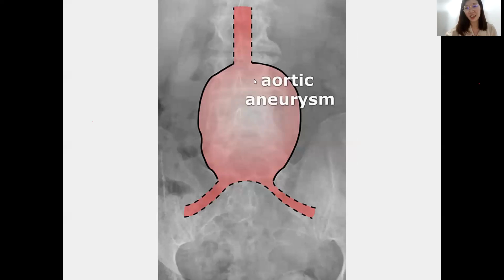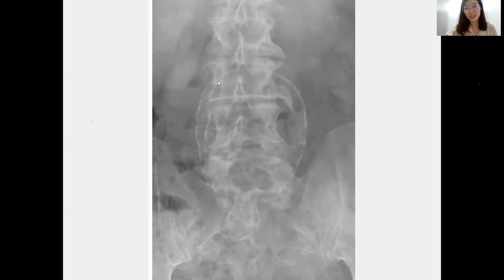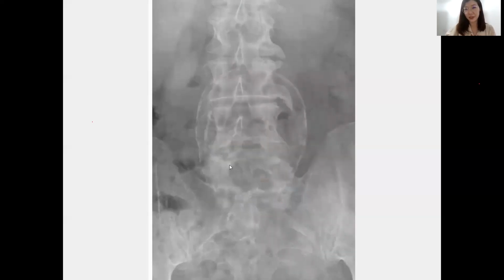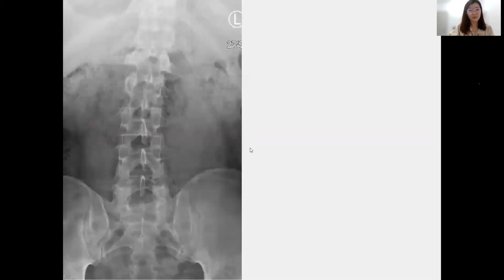See, this is the aneurysm with the wall calcification. These images are taken from the internet, but I've seen it in a real patient as well. It really looks like this. Always at the paraspinal region, there are interesting findings. Calcified AAA. All right, good.